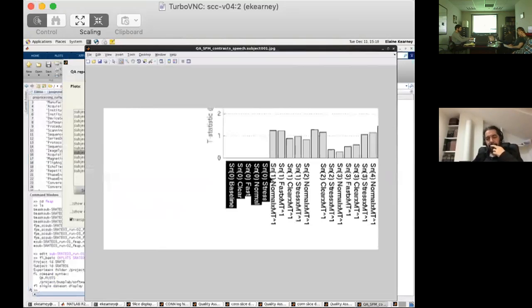So when you look at this plot, we see for session 3, normal, fast, and clear MT. So my understanding of this is that it's just talking. We have these columns that are the duration for those conditions, right? So, right. And so what would result in just this estimate being lower for a given one of those in a given session?